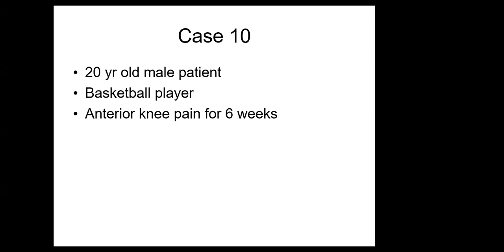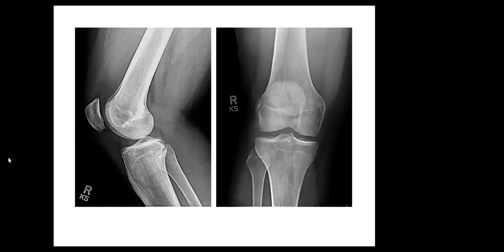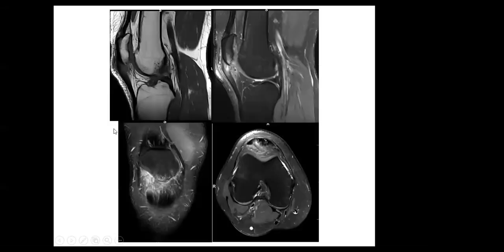So you could tell that the inferior pole of the patella is irregular. Yes, maybe you're right. Maybe there's a small bony avulsion here. Okay. Now, there is a difference between Sinding Larsen Johansson and jumper's knee. Do you know what the difference is?